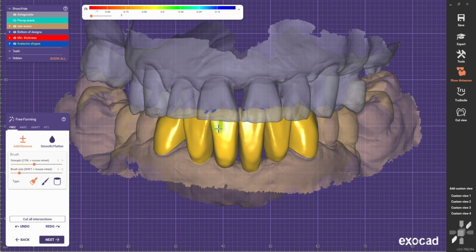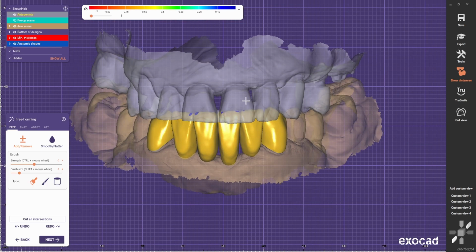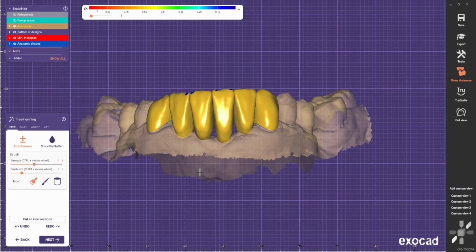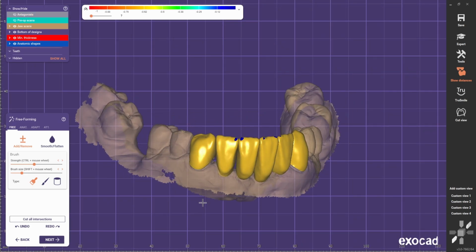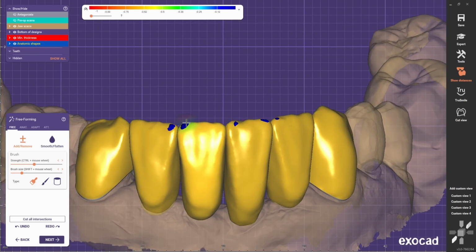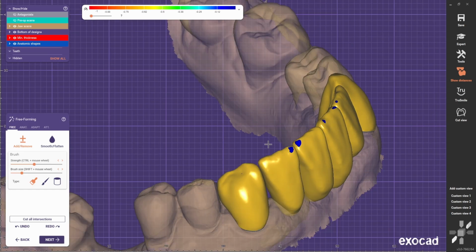Given the fact that the patient, as you can tell, is not very young, and the incisal edges on the upper are quite flat and worn down, we need to do the same on the lower. It doesn't make sense to have lowers with mamelons and regular incisal edges when an older person usually has flat incisal edges.